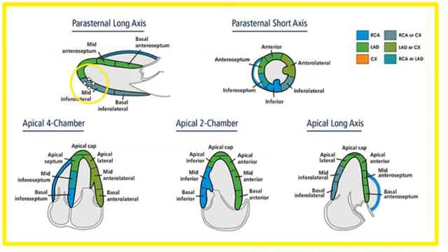And then after that, you'll have what we call the inferolateral portion of the heart in this view. And you'll have the mid-inferolateral, which is basically the middle part, as the mid-anterior septum is here, and the basal inferolateral, which is at the base of the heart. So you can see we have basal segments, mid segments, and apical segments of the heart.